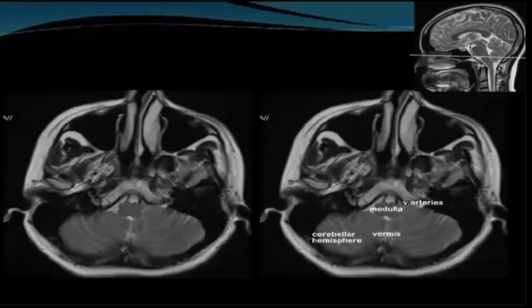Okay, moving forward, or below, according to the diagram above. Now, here we're supposed to see the cerebellum very posteriorly. This is the vermis, the part that's most anterior. And on the peripheries, posterior and lateral, we have the cerebellar hemispheres. In front of them here, we have the medulla. And then, as we said, the vertebral arteries are supposed to appear as these black parts. So that's what we're looking at.